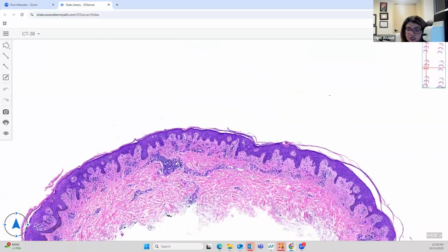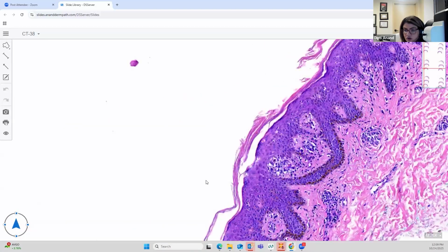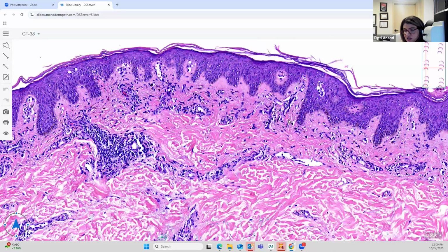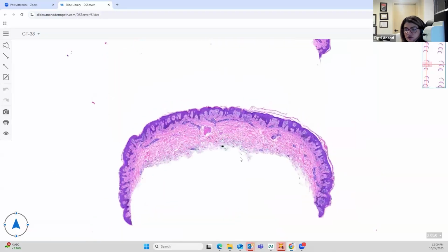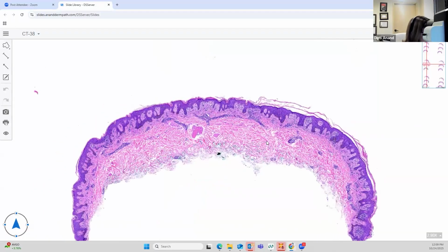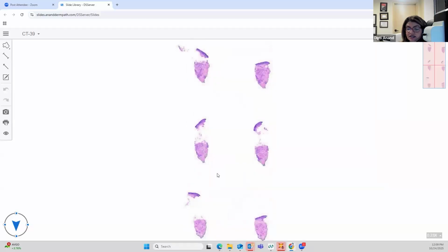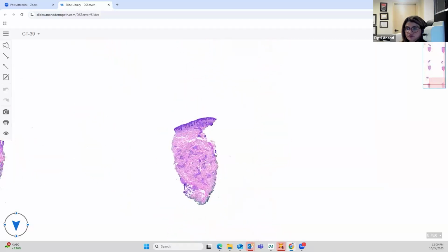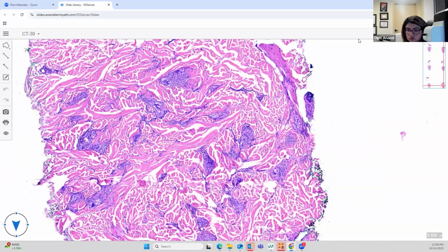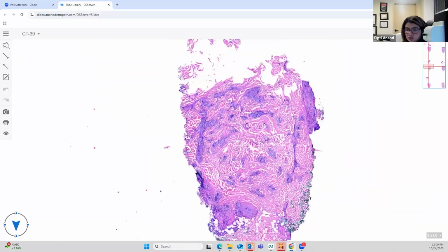The closest differential for this would be guttate psoriasis, but these are clean mounds, no neutrophils. Again, this is what is referred to as pityriasiform spongiosis, very delicate spongiosis, superficial perivascular inflammation, few extravasated red blood cells, but everything about the slide is very subtle, including these mounds. So this would be pityriasis rosea. And yes, the answer would be E. Good. Let's go to the next one, which is your slide 39. Okay. It's a really nice slide, this particular entity.